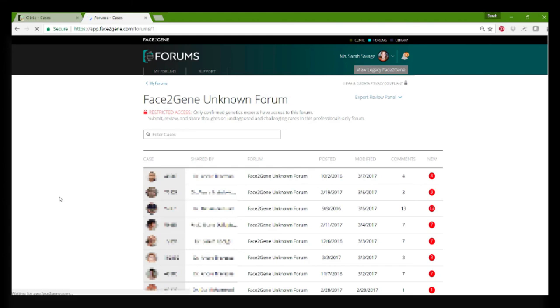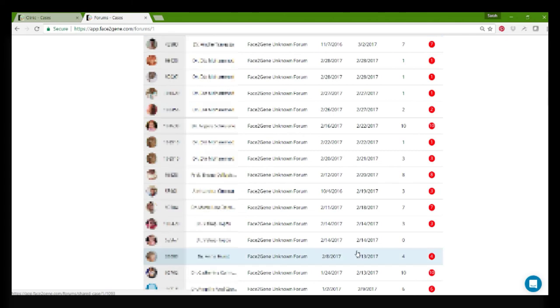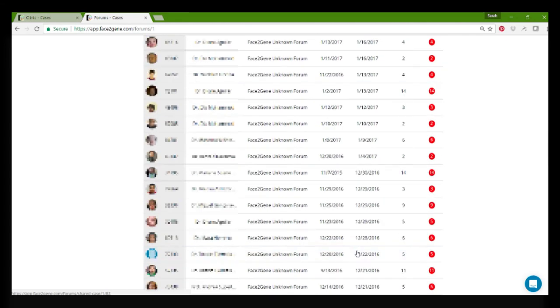So you can see here that there are a number of cases that have been entered, and there's very active commentary from some of the top dysmorphologists around the world and users of the Face2Gene system. So we can explore an example here.